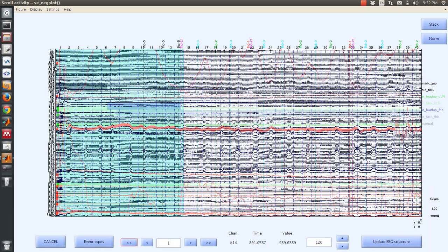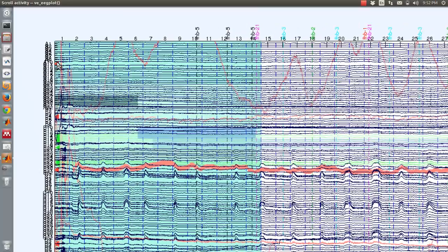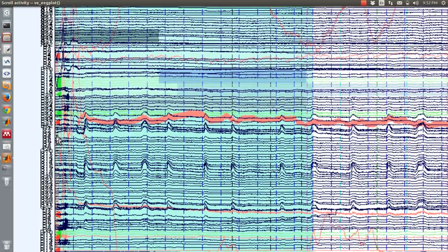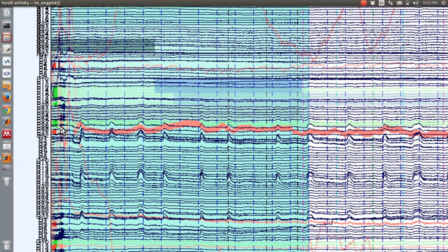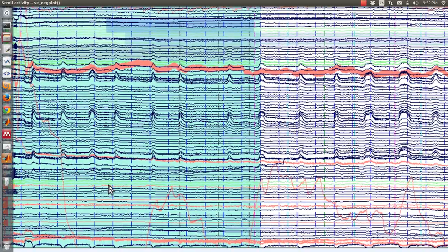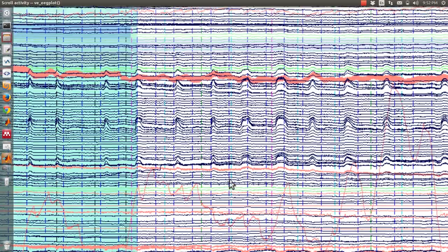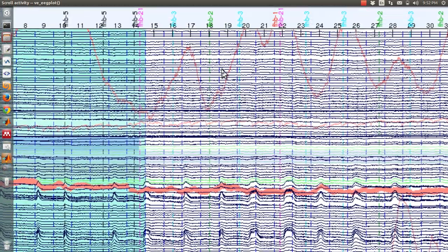And then they also have these red tags along the axis pointing at the channel labels that they correspond to. And then we also have these green channels. These are the ones that have been flagged as likely being bridged to their neighbors. So we can see a few of them have been flagged for that as well.